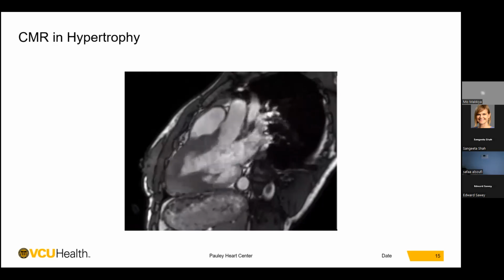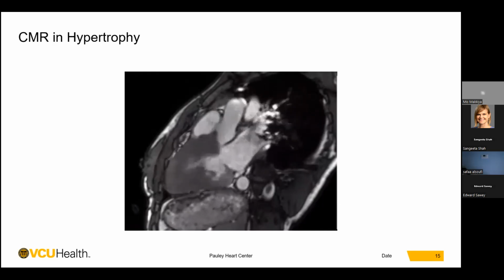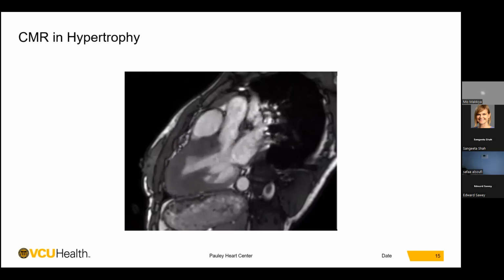mass diameter or cardiac myocardium diameter evaluation. Moreover, bright-blood SSFP imaging in cardiac MRI can detect other abnormalities associated with HCM, such as the presence of congenital ventricular outpouchings, recesses, diverticula, aneurysms, clefts, crypts, anomalies in the mitral valve apparatus, and abnormalities of the papillary muscles.